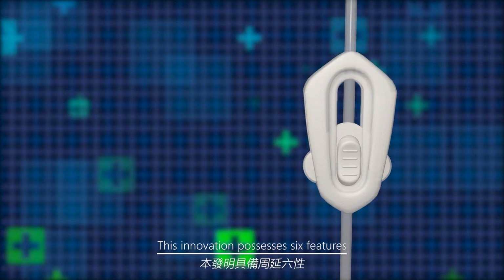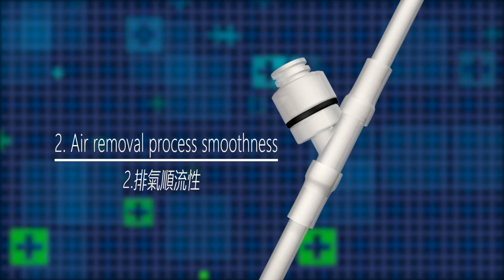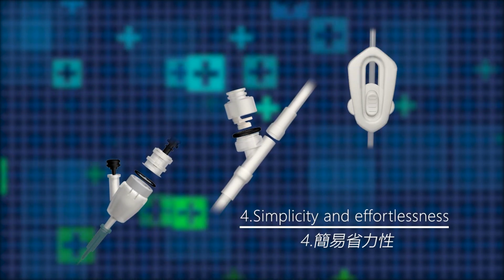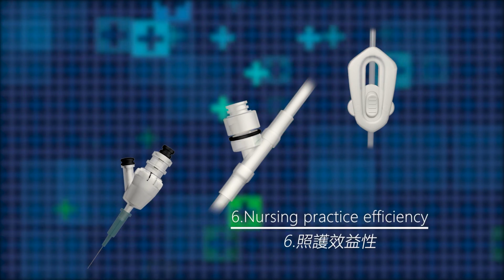This innovation possesses 6 features: 1. Usage safety. 2. Air removal process smoothness. 3. Air removal process efficiency. 4. Simplicity and effortlessness. 5. Operation convenience. 6. Nursing practice efficiency.